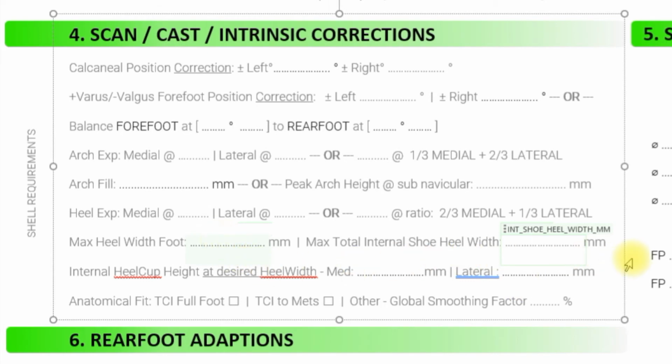What we're doing with the lovely electronic automation is, if the two don't match up, it'll hold and you'll get an indication on your account page to say that there's something wrong and we need to clarify what we're going to do before we go ahead and print it.